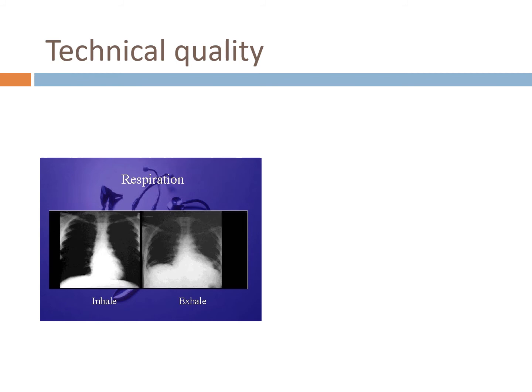So you're looking at the different exposure of the film, but hopefully if they recognize that it's not exposed right, that they'll redo it. So an MRE question, you want to be able to see at least 10 ribs for expansion to make sure you have a good inspiration. Okay, so that's part of the technique that the radiology person does if they're shooting an X-ray on a patient that's spontaneously breathing. They tell them take a deep breath in and hold it and let it go, because they want that good inspiration.